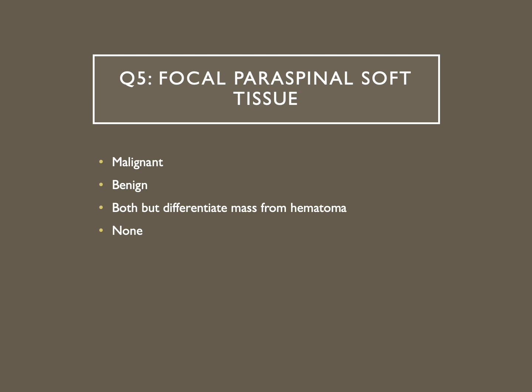And when we look at paraspinal soft tissue, remember, you'll see it in both, but you want to differentiate a mass from a hematoma.